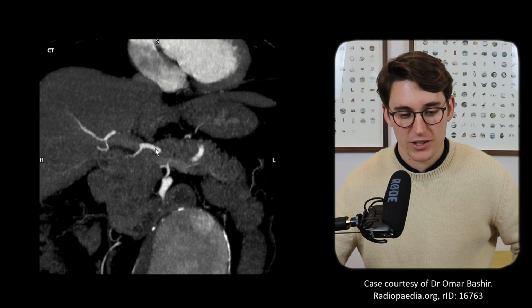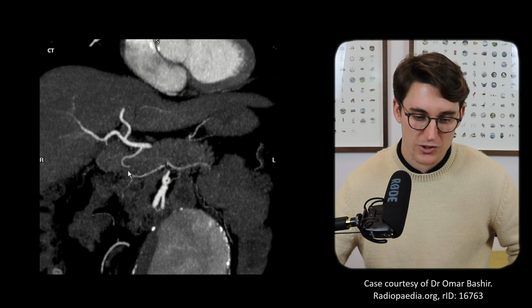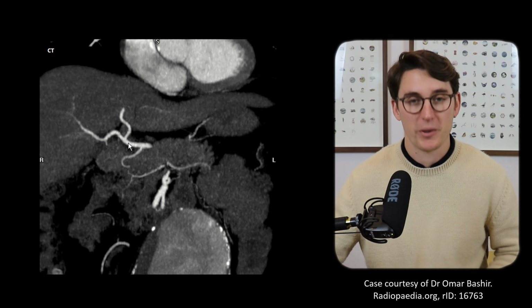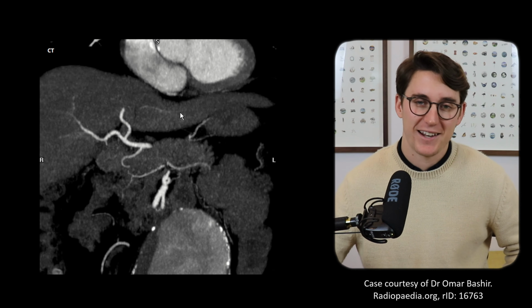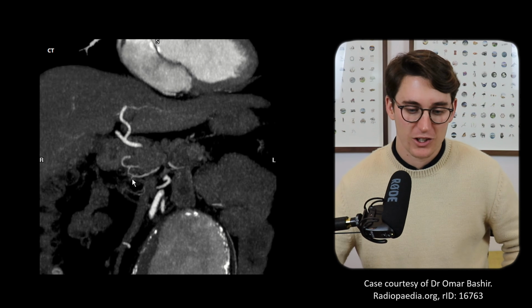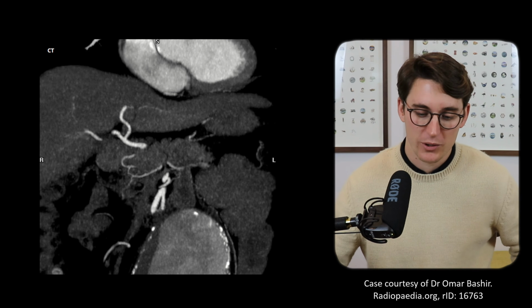We head out laterally following this artery. It plunges down, giving us our gastroduodenal artery here. Once that gastroduodenal artery has come off, this is called the proper hepatic artery. And our proper hepatic artery bifurcates, as we know, into right hepatic artery and left hepatic artery. That gastroduodenal artery will then give off some superior pancreatoduodenal arteries, as well as heading all the way around, giving us our right gastroepiploic artery.